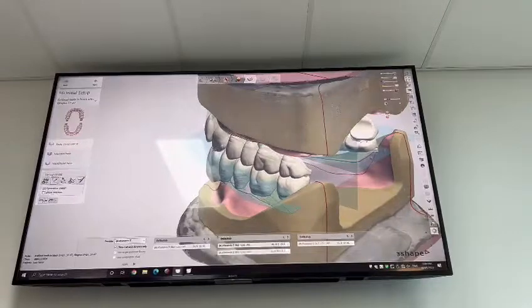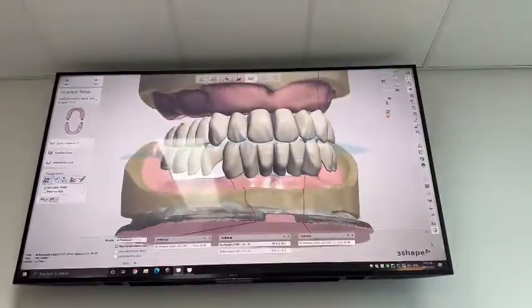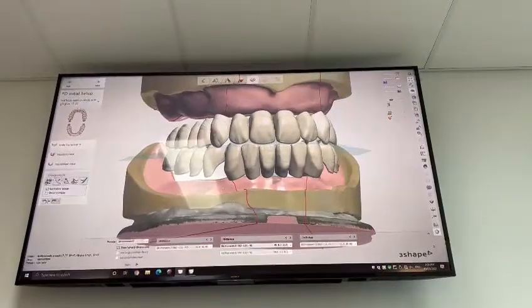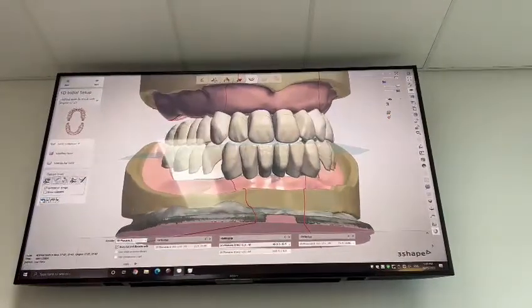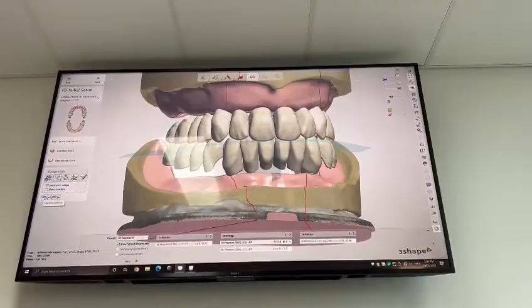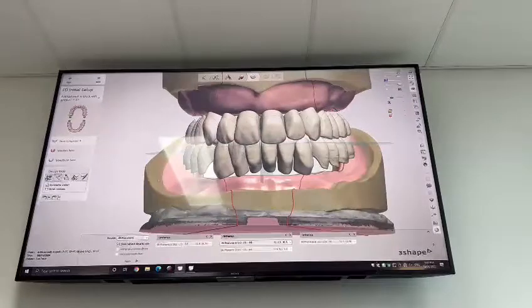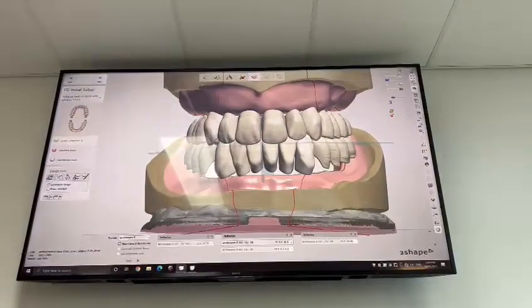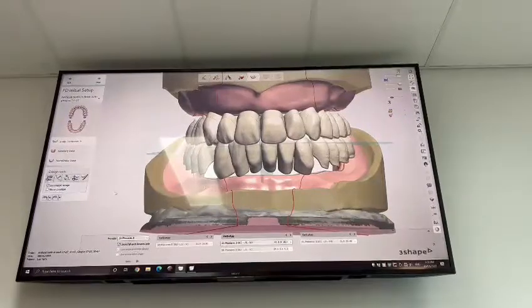Oh, that wasn't a very good example. If I bring these out here, you'll start to stagger them and they'll all get funny. So I prefer to avoid that tool on uniform cases like this one. It'll also throw your overbite out.